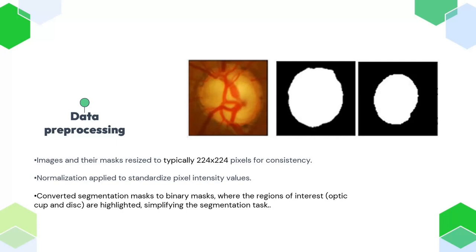And next, we created the binary masks. To facilitate the training process, the masks are converted into binary format. This transformation simplifies the segmentation task by converting the pixel values into distinct classes, typically foreground and background. These pre-processing steps are designed to prepare the data for optimal performance with a UNet model, ensuring that the input is clean, standardized, and ready for the segmentation process.